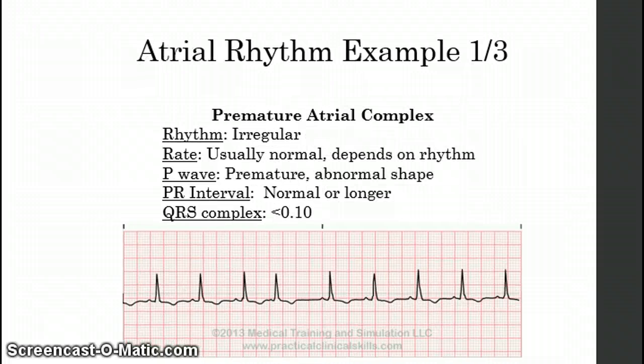So some atrial arrhythmias that happen outside of the SA node. Here is a premature atrial complex, which is irregular. This can be caused by too much nicotine, caffeine, anxiety. The strip is usually regular except for one beat. Here the P wave is present but abnormal in size. The PR and QRS are normal. The underlying causes must be treated if the patient is symptomatic.